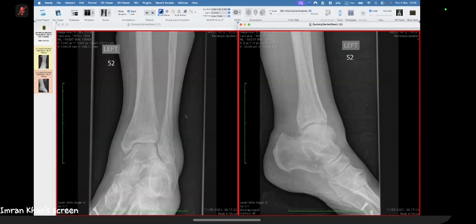I can also see screws down near the... Okay, fine. Ignore the osteoarthritis at the midfoot. Ignore the screws. The soft tissue swelling is actually subcutaneous lymphedema related to mild heart disease. She's got a history of mild congestive cardiac failure and some chronic venous insufficiency. Ignore all those three. Can I just make more focusing?